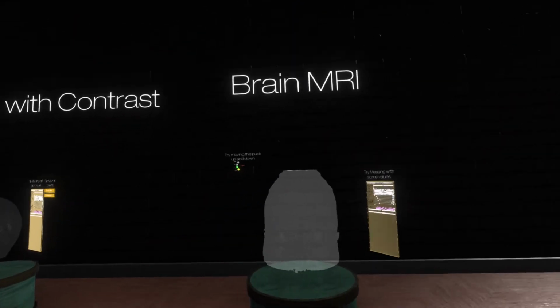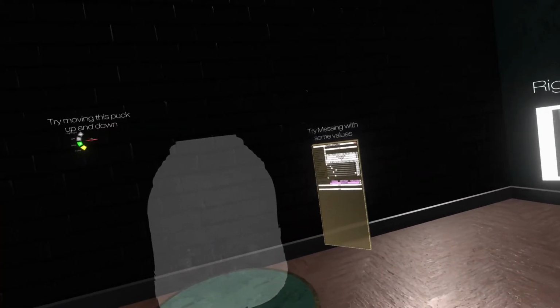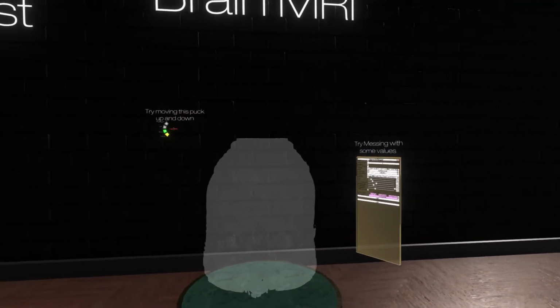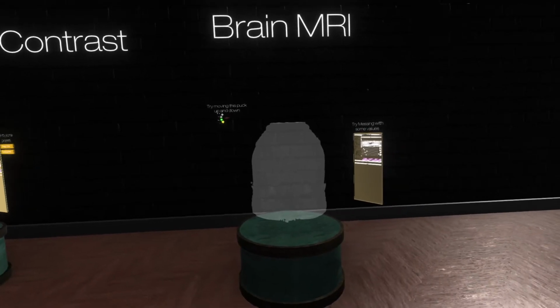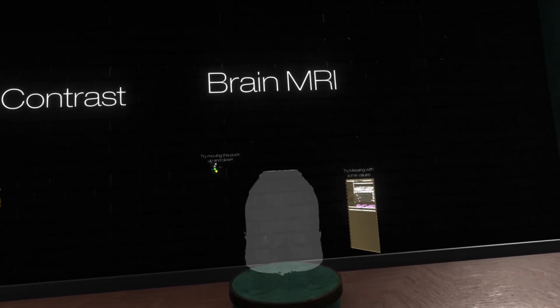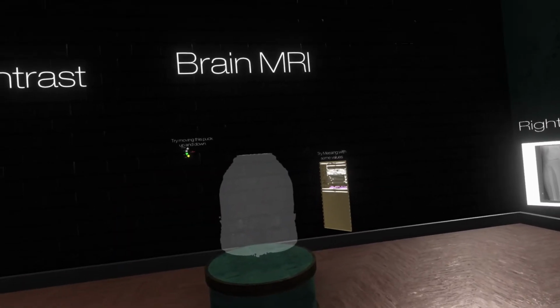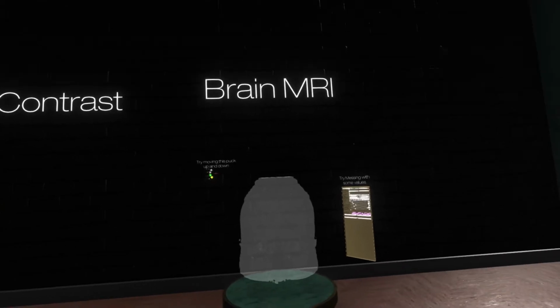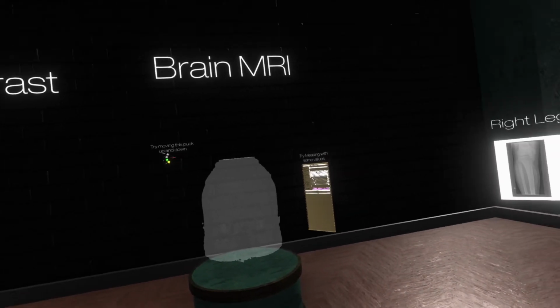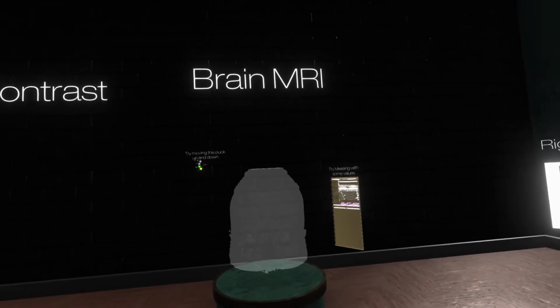Following on from that, I've got a low power sort of emergency room MRI that was taken of me. This MRI comes in from the raw files, which are given to you via the hospital that you get an MRI taken from. If you have had an MRI or any sort of imaging, including X-rays, in the past, you are usually legally able to get those images and use them wherever you'd like. So request them from your hospital or medical center, and they should say yes.